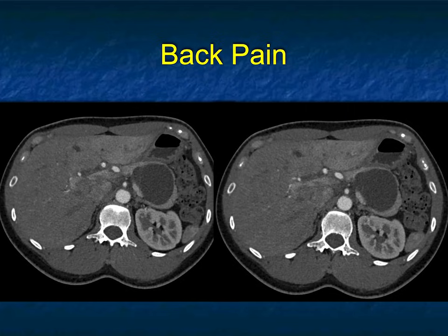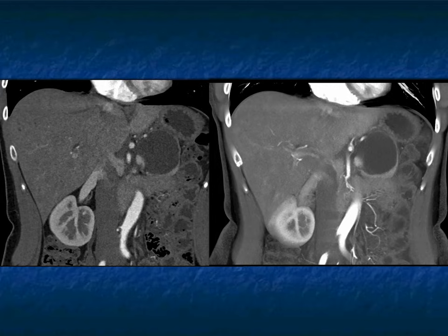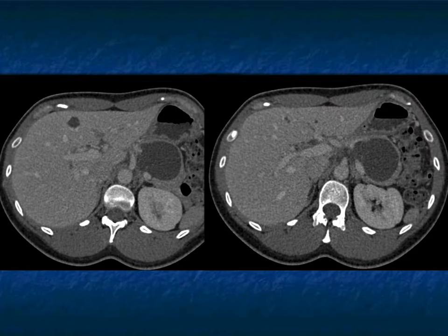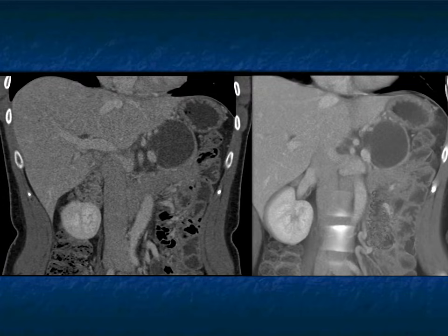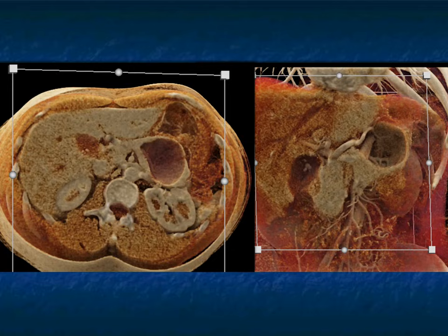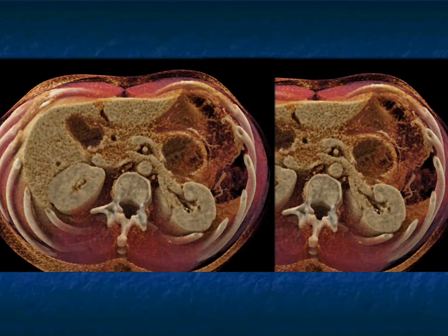Another one, cystic lesion, tail of pancreas, thickened wall, no septations, no nodularity. Could be a cystic neuroendocrine tumor. Could be an IPMN with dysplasia. Could be a serous cystadenoma. Could be an MCN. It doesn't look like a simple pseudocyst. There's an enhancing rim. When I see an enhancing rim, it always pushes me to a neuroendocrine tumor. I don't see liver mets. I don't see other lesions. You can see the wall of the lesion nicely, particularly on the cinematic rendering images.